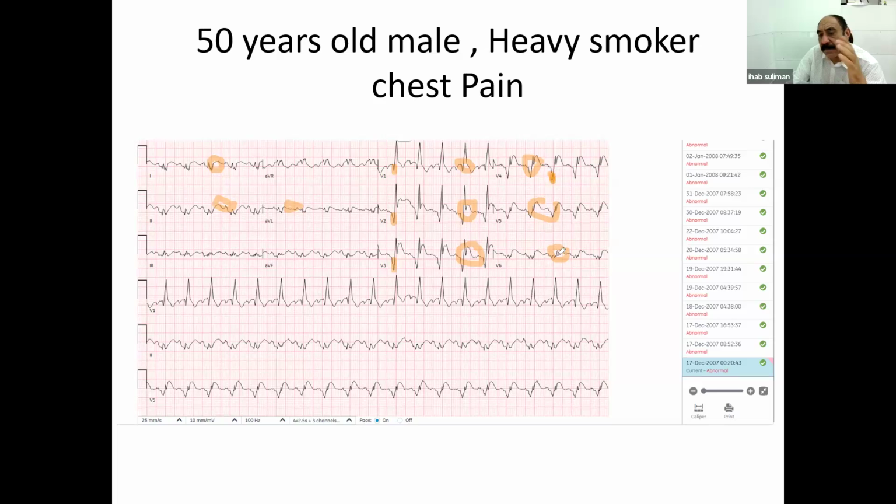So this patient probably presented within 6 hours of chest pain. It looks like he is in sinus tachycardia. It is a regular tachycardia, and there is right bundle branch block. V1 is positive in V1, V2, and V3. So this patient presented with an extensive anterior STEMI, with right bundle branch block in sinus tachycardia. The patient obviously had an extensive MI.